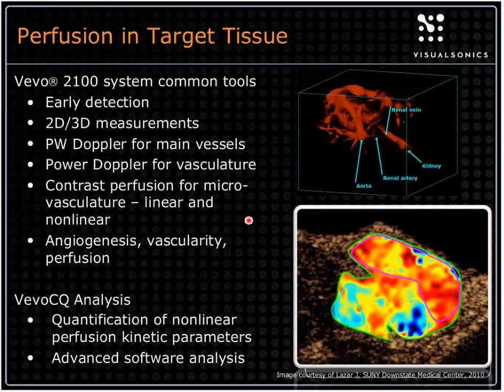contrast in that it's a direct visualization of the signal coming from microbubbles, and is much more sensitive. And VevoCQ works strictly with data from a nonlinear contrast mode. And this allows you to do all sorts of interesting investigations into angiogenesis, vascularity, perfusion kinetics, and things like that.